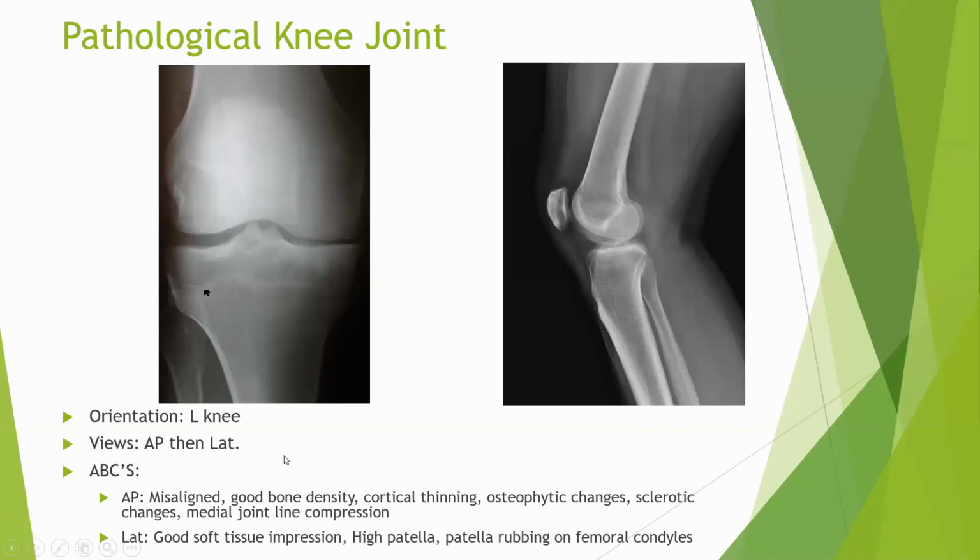Obviously, as you can note, there is a good amount of bone density, and this very, very faint grayish or darkish structure is saying it actually is not osteoporosis. If the patient has osteoporosis, the darker colors are very pocket-like, rounded structures. Like over here in one pocket, it will be dark. Right over here in another, it will be dark. But consistently overall, with such a smooth surface, it is usually not the case.